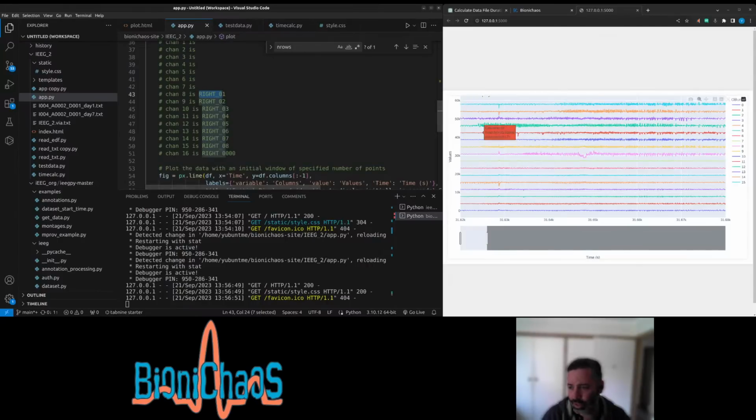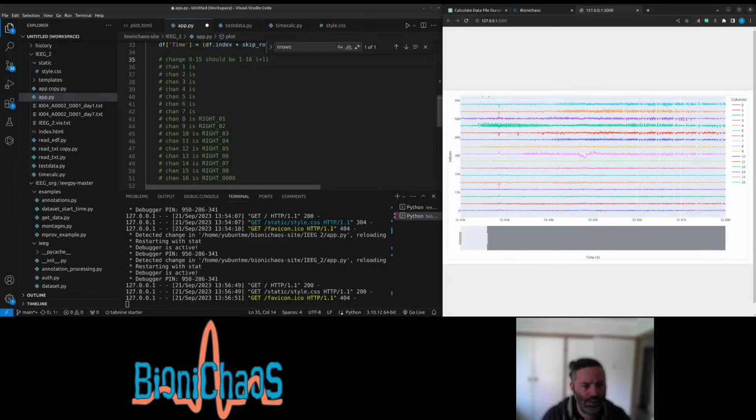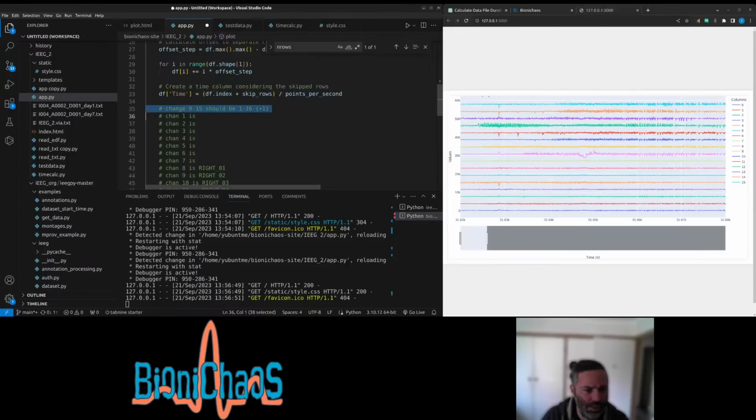All right, no, that is correct because it actually should be, was it, so we need to change 1 to 16. I mean, does it even matter? No, it probably doesn't matter. Yeah, we can get rid of that for a sec. So it should be 0, 1.